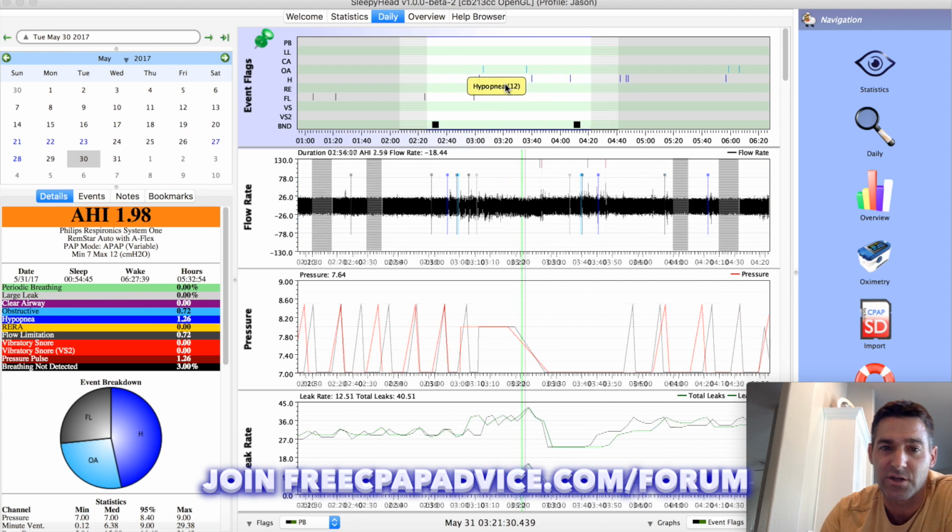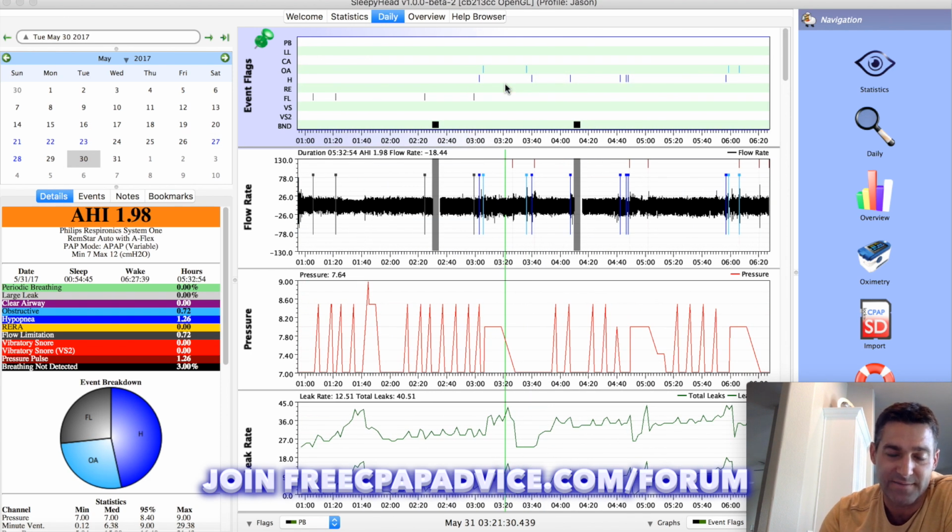So another nice thing that you can use this for is, if you have this on APAP and you're brand new to CPAP and you're trying to self-treat, it's kind of nice. You can look at the pressure trend here and you can see, oh, it went up and I did worse, or it went up and I did better, and then it went up here and I did even worse, but then it drops down and I do better. Well, you can look at the pressure line here, and it's telling you what pressure it is.